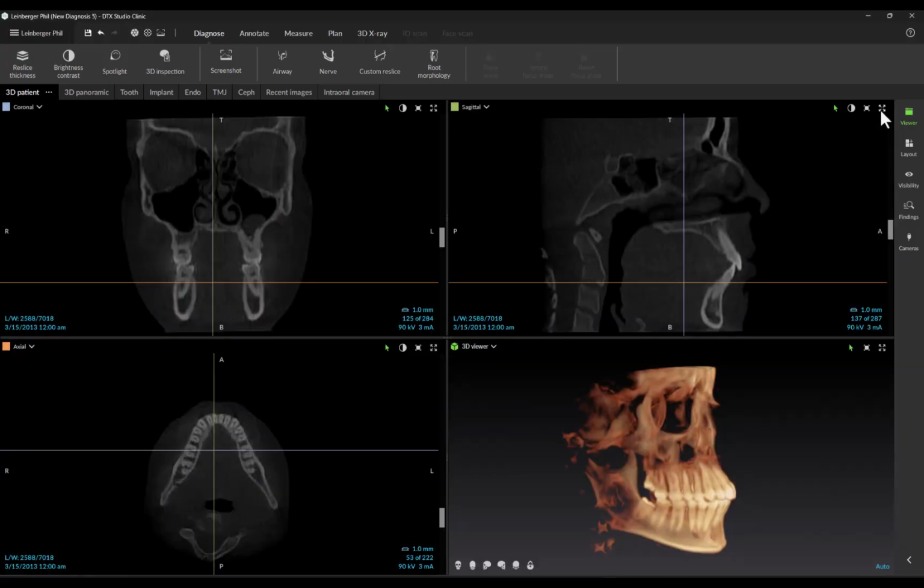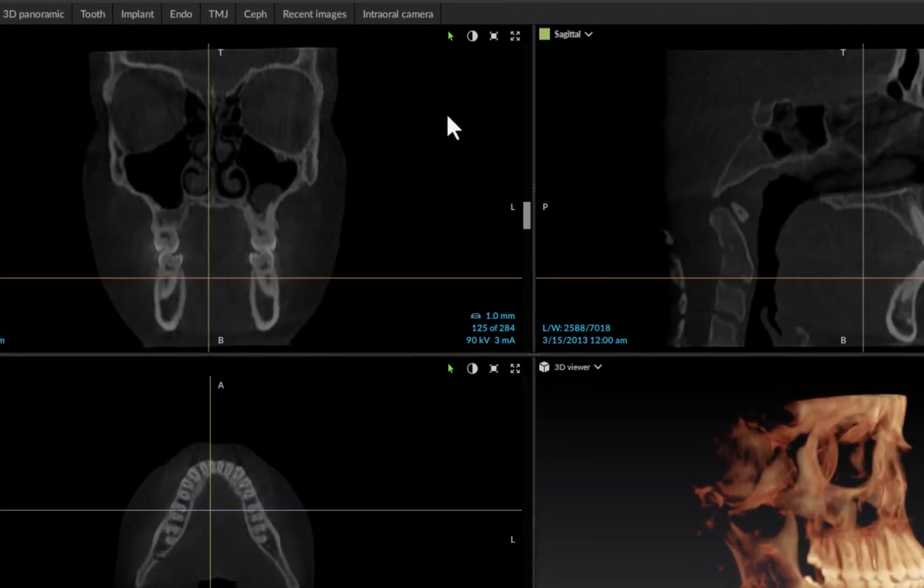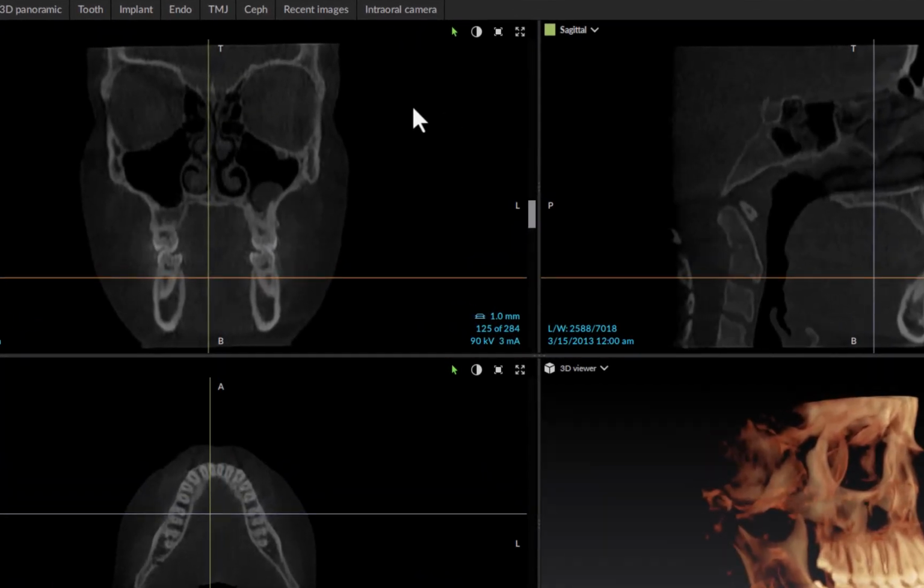Now looking at the actual slices themselves, if I look at my coronal aspect, there's a lot of things you can see which will be great for an orthodontist just with that initial scan, or really, like I said before, for our GPs, for surgeons in general. So I'm going to scroll through my coronal slice. One helpful tip is that if I make my slices a little bit less contrasty, I can sometimes see the details of the sinuses more clearly.